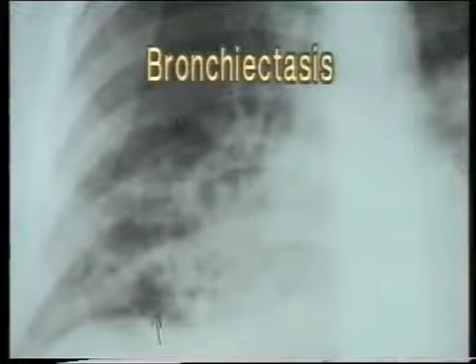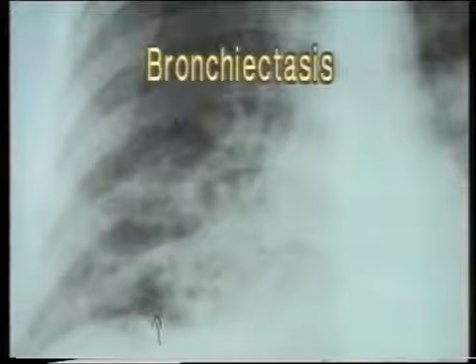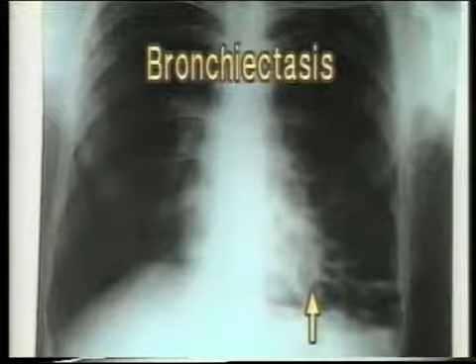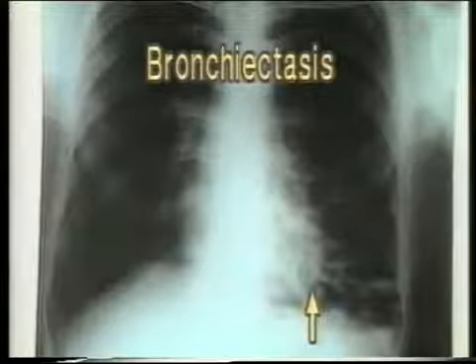The cysts are very thin-walled and some may contain a fluid level when in the lower lobes. This is another X-ray of a patient who presented with chronic cough with copious foul-smelling expectoration. Note the multiple thin-walled cystic areas in the lower zone of the left lung.